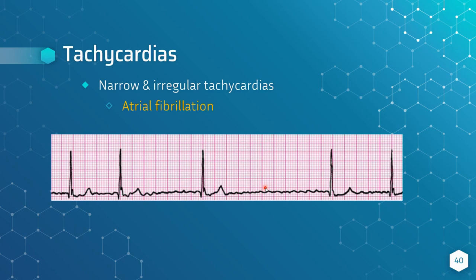Again, so here's your atrial fibrillation. The atrial activity is fibrillating, because remember, you have multiple electrical activities going on here and reentry circuits. So the atrium is basically quivering, since there's about 400 impulses happening per minute. And so since those ventricles aren't getting all of those impulses, that's why your rhythm is going to be uncontrolled and irregular. And this is the most common arrhythmia in patients 65 years or older. About 80%, 85% of the atrial fibrillation patients are in patients that are in elderly age.